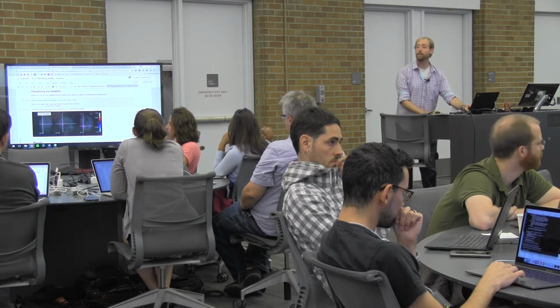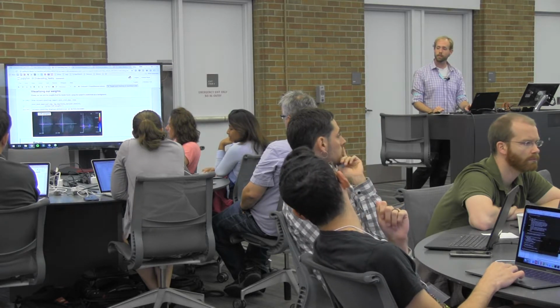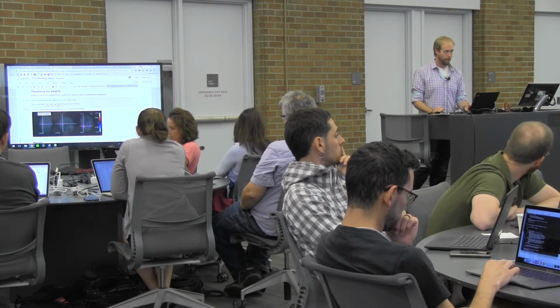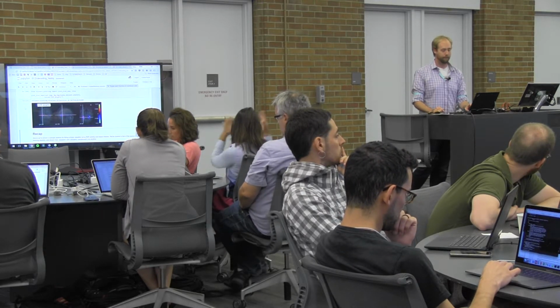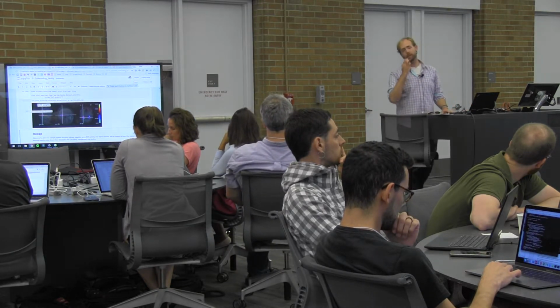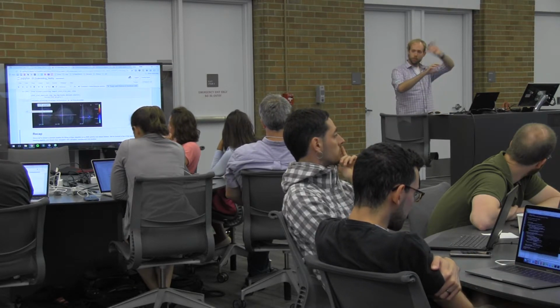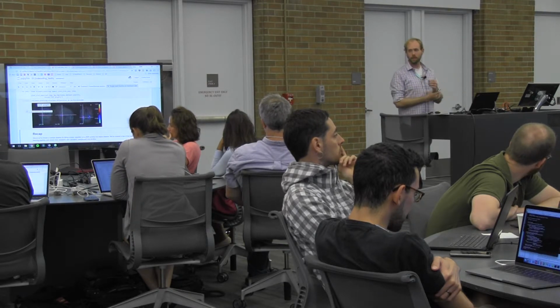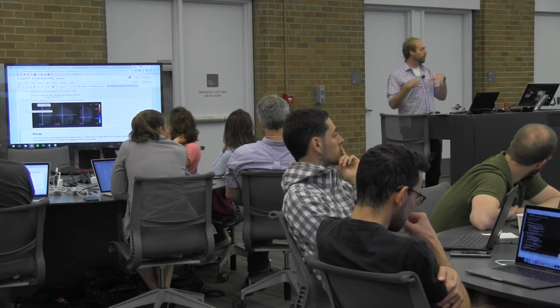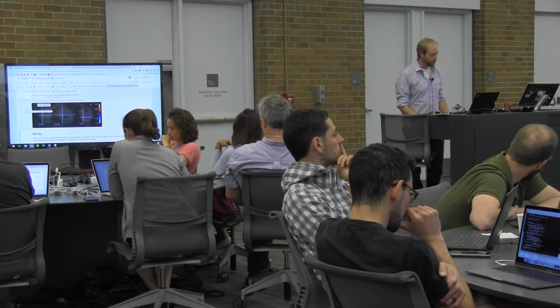And yeah? If you look at the size of the fMRI mask image or the SVC coefficients, it is much less than the 40 times 64 times 64. So nilearn realizes that it has to put it into that bigger shape. Yeah, so the masker object tries to be smart about knowing what space it needs to project data back into. It's an unnecessarily complex thing to do individually just to keep track of it, but it's a good thing because otherwise you have to manually do it. Right.